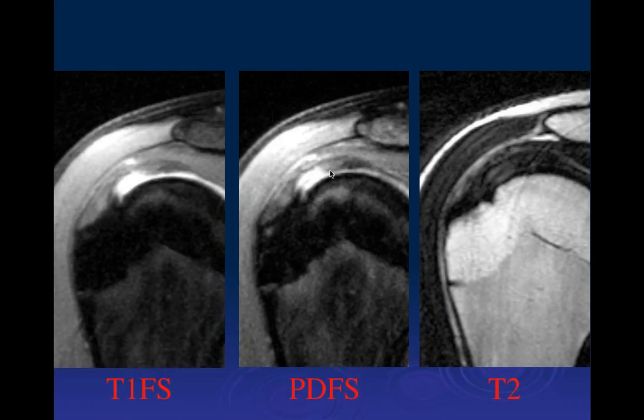But what we see is that you can get tendinosis which absorbs contrast. But when that happens, you almost always see a black thin line here. We'll talk about this in much more detail when we get to the rotator cuff section. When you don't see that thin black line, that correlates very well with an arthroscopically detectable partial tear. And we'll talk about partial tears in much more detail when we get to that section. Right now, I'm primarily just talking about technique.